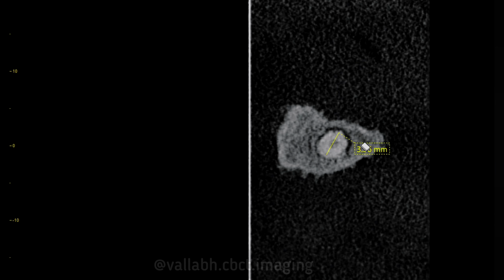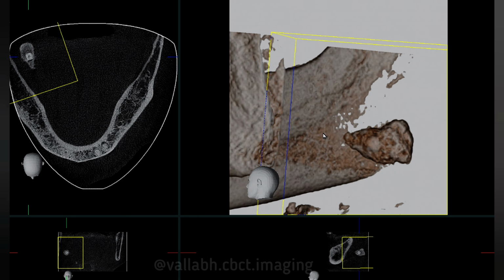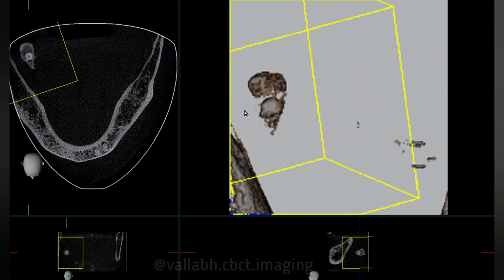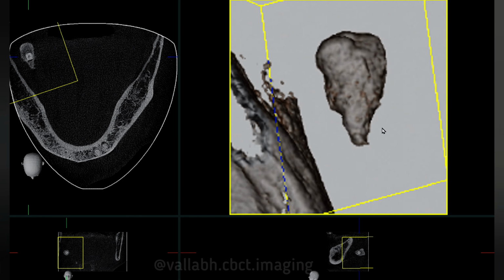The clinical history is not known. This is the radiolucency, the radio opacity, and the outer radio opacity. This radio opacity itself is surrounded by a radiolucency, as you can see over here. So this was all about the salivary gland stone and an incidental finding of a tooth-like structure inside the salivary gland stone. Thank you so much.